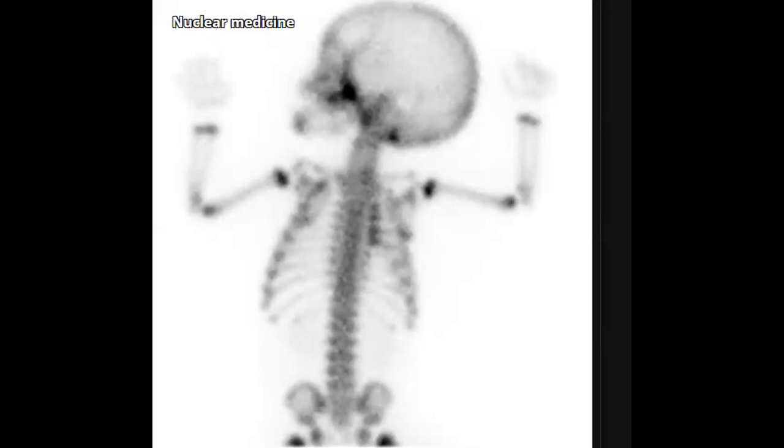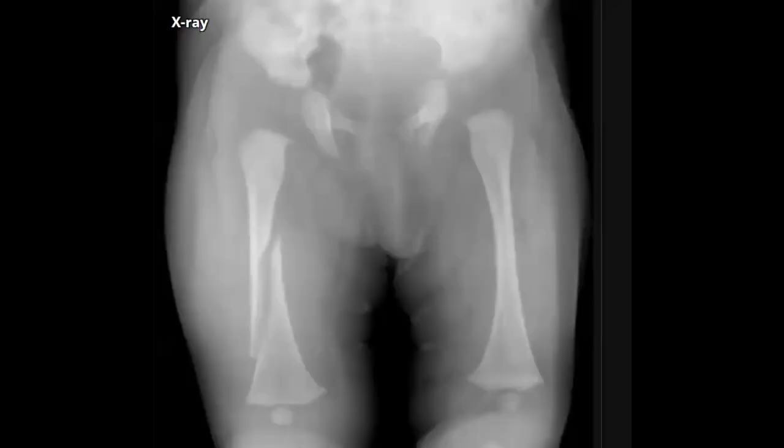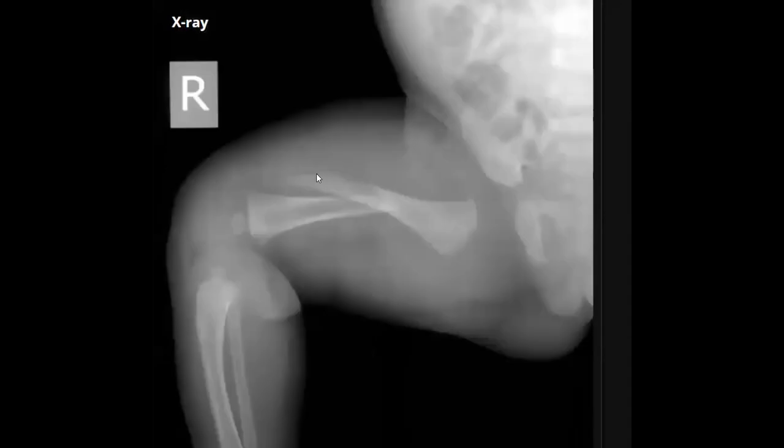Yes, Noha. Perfect. I am thinking about posterior rib fractures. It can happen, and it shows this type of uptake in this age group. You have to worry about non-accidental injury. I will do an urgent skeletal survey and CT brain for this patient. This patient is non-accidental injury. You have to mention this for the examiner. Excellent. Bravo.